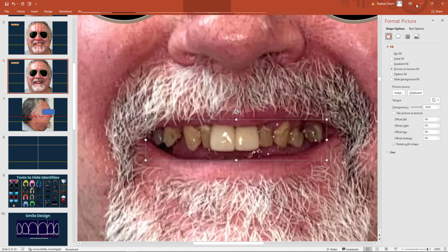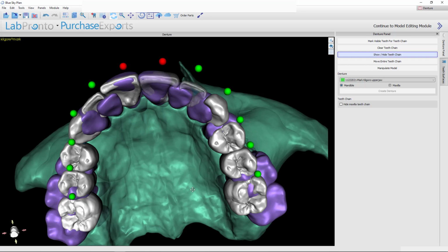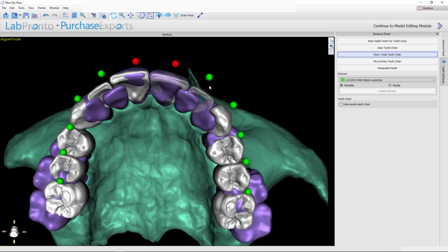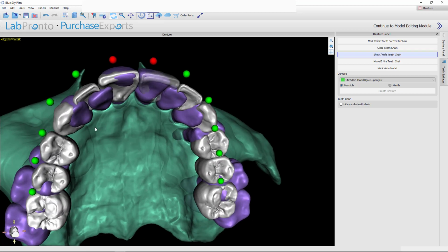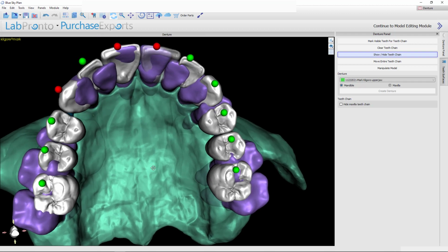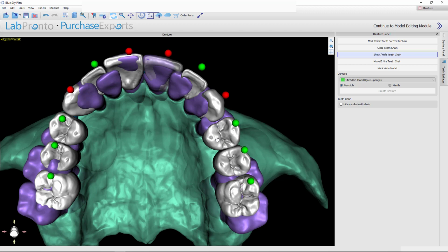I want to widen this arch out, broaden it a little bit. Those teeth look too small for a big dude like this. This side I'll make about the same change, just a slight tweak inward. All right, canines look pretty good. Now these posteriors do have to get widened, so now I'm going to lock it at the canines, and I'm going to expand outward.